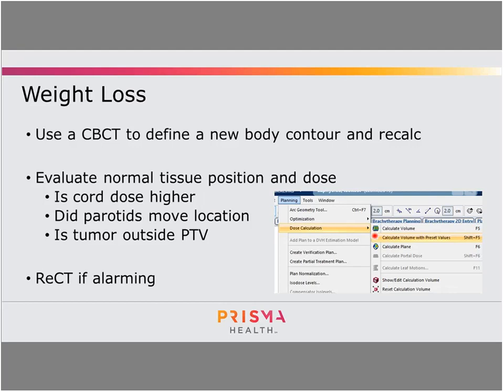And also at that point, a physician might say that they want to re-CT because they're just not sure. And when you re-CT a patient, it doesn't mean you're replanning the whole patient. It just might be a more accurate way for you to calculate the current plan onto it and evaluate. But weight loss is a real thing that happens in these patients, and it does need to be evaluated on a large majority of them, especially around fraction 25.